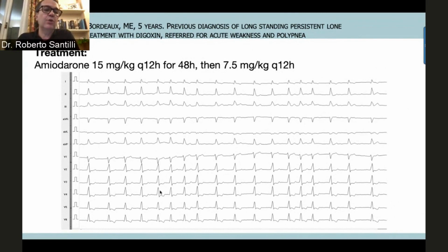I think we will do a journal club on that, maybe either on Facebook or on Instagram, to show you the importance of looking at the R peak time in lead V1 and in leads from V2 to V5, V6, particularly V5. And again, look how nicely the distance between the beginning to the peak of R in the right ventricle is earlier than the peak in V2, much more than 15 milliseconds.